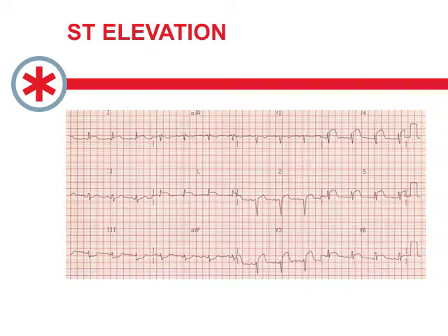Now this is ST elevation, but while we're sort of thinking ST depression, the only caveat to not being able to localize things is the ST depression that we see with reciprocal changes. So in this case, if you have a peek at the ECG, your eye is going to go very rapidly to the ST elevation, right? In V2, V3, V4, V5, V6, 1 in AVL. So this is a pretty large anterior and anterolateral MI. And then you're going to get ST depression, and you can certainly see it in 3 in AVF here, which is the reciprocal changes.